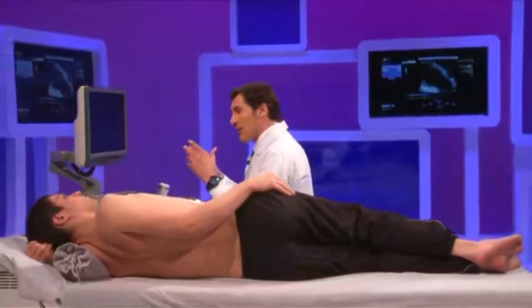So quantify the mitral regurgitation. And finally, efforts should be made always to quantitate, giving some numbers. But efforts should also be made to have an integrative approach of all these parameters. And finally, try to evaluate the consequences on the left ventricle. Thank you. Good luck with it.